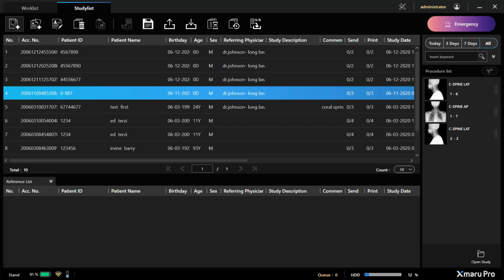Also on the top toolbar, you'll notice that the most common file parameters are available here. Moving the images, deleting studies, save as, all of them along the top here, but they can be adjusted as you need. The settings bar is up here, replacing the little circle that was in the earlier version.